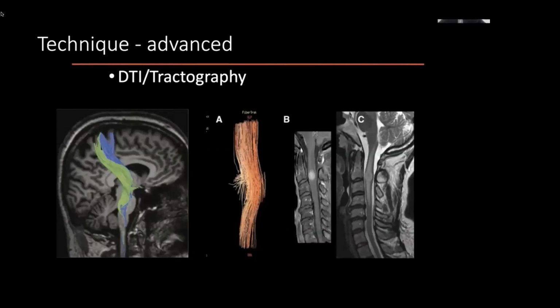Can you guys think of any areas where seeing restricted diffusion may be helpful in the brain, for example? Definitely seen it used looking for restriction in abscesses, strokes. Yeah, very good. So differentiating abscesses, which have hypercellular pus, as compared to tumors which are not hypercellular. Yeah, that's one area where restriction is useful. Also for stroke, exactly. So in acute stroke, particularly acute to early subacute stroke, you see restricted diffusion in the brain following the stroke.